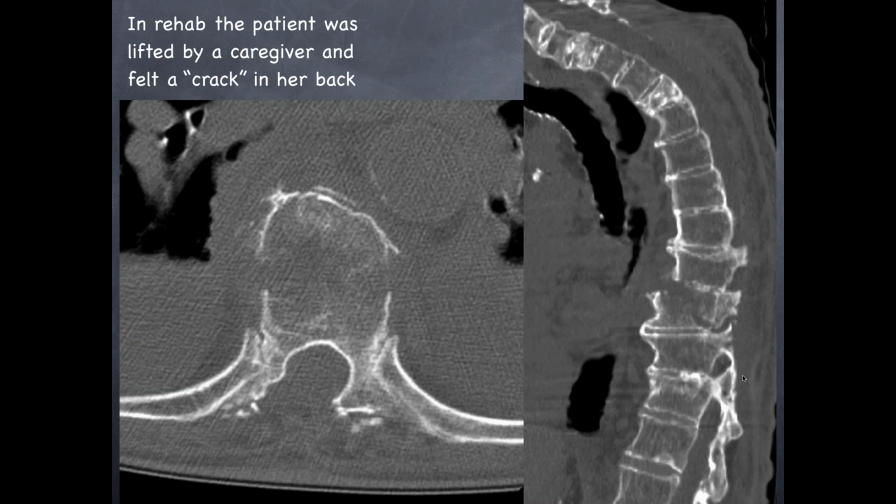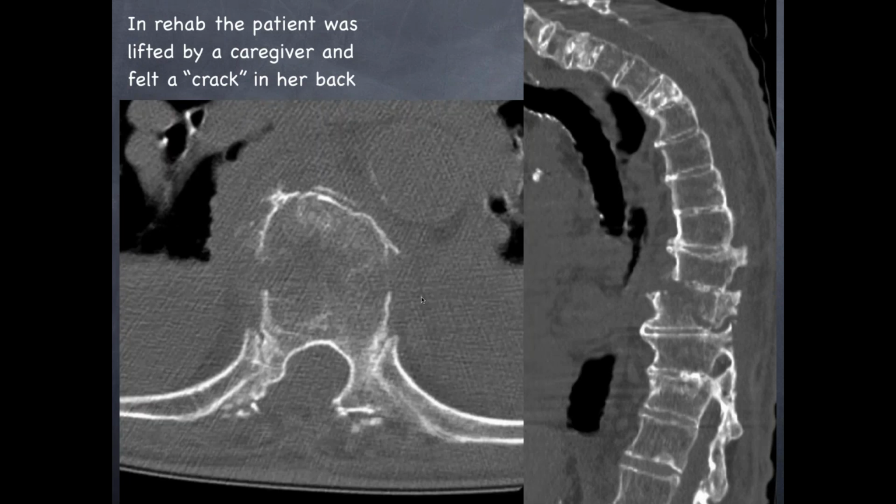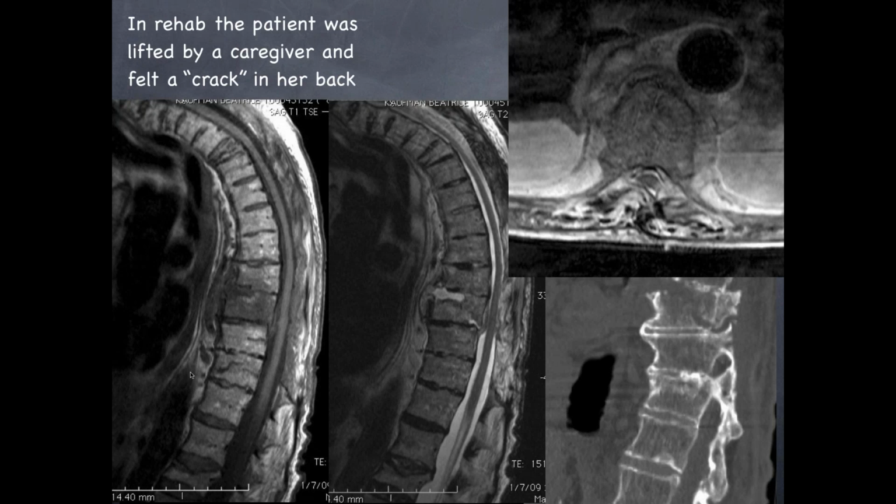This patient is probably 70 or 80, I would think, probably a female. Here's the MR scan. So there's an overlying hematoma. It's strange because on the axial X-ray or CT there were also large bilateral pleural effusions, probably hemorrhagic, but you don't see them on the sagittals for some reason. Anyways, on the CT, there's a hematoma overlying the spine from this fracture, and I don't think there's any significant retropulsion. The cord seems to be okay.